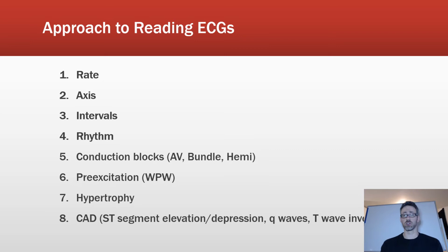So really just doing those four, if you don't remember anything else, if you do those four, you're probably in good hands and you'll be able to assess an ECG and evaluate many different things. I added 5 through 8 as reminders of important things not to miss, right? That really can be included in the first four as you're going through it.